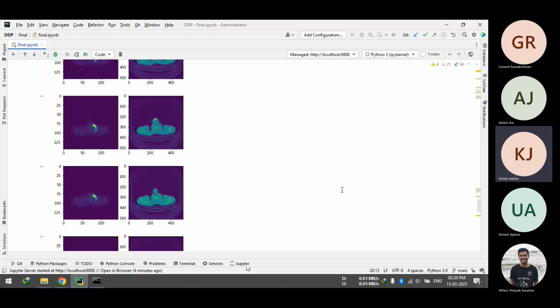Could you repeat, if you don't mind? I'm sorry, I didn't follow. Yeah, actually, I'm just saying, suppose we want to identify an organ, say kidney. I want to search for the kidney. Why should I go to the head and neck region? We'll search for the kidney in the abdomen region. I'll not go in the thorax, not in the head and neck, not even in the pelvis. I'll be identifying the kidney in the abdominal part. So for that reason, if you want to do that, it is fine.